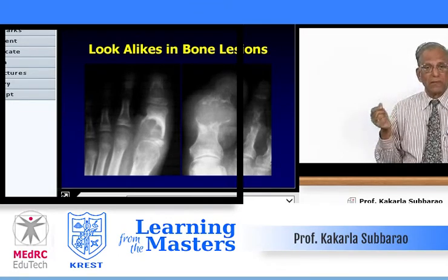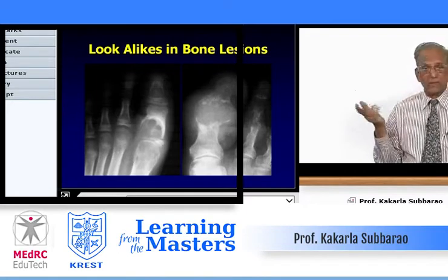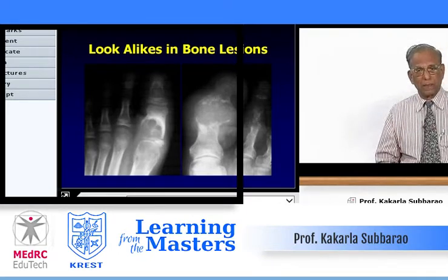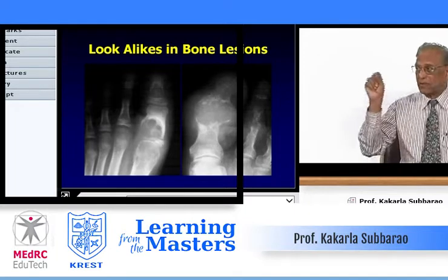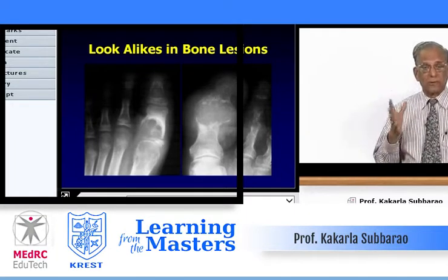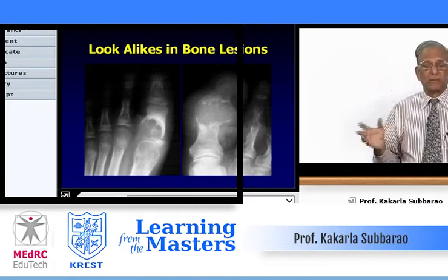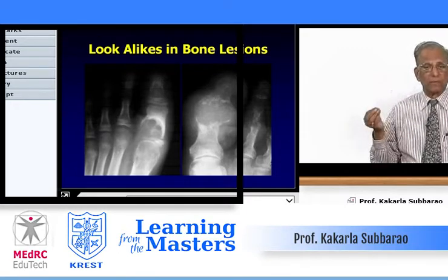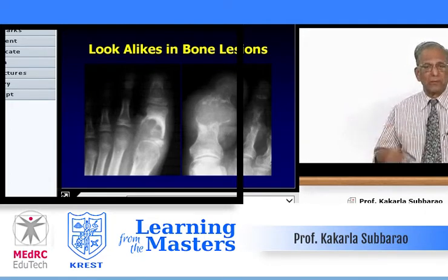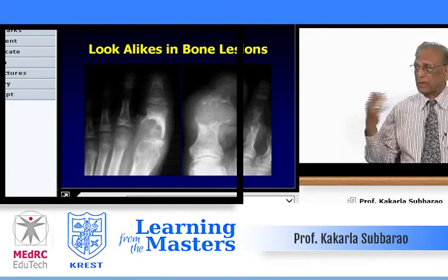So in benign lesions, what type of lesion produces this? It's not calcific, and he's too young for a giant cell tumor, although it is going all the way to the articular margin. And then in giant cell tumor, you don't get such a thick sclerotic margin. So you have to come to a conclusion, it is an osteoblastoma. The child comes with some pain, not relieved by usual drugs, and then this is the lesion.